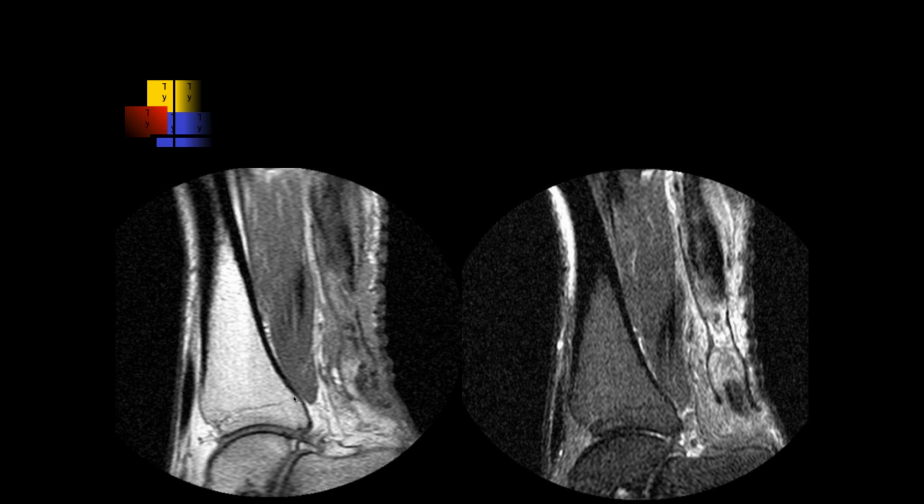So here again, we have some sagittal images, and I don't see the Achilles tendon insertion well on the calcaneus, and there's additional tearing just above the insertion. This is a patient who had a full thickness tear and had surgery. A week after surgery, they fell on the stairs and came in now with increased pain.